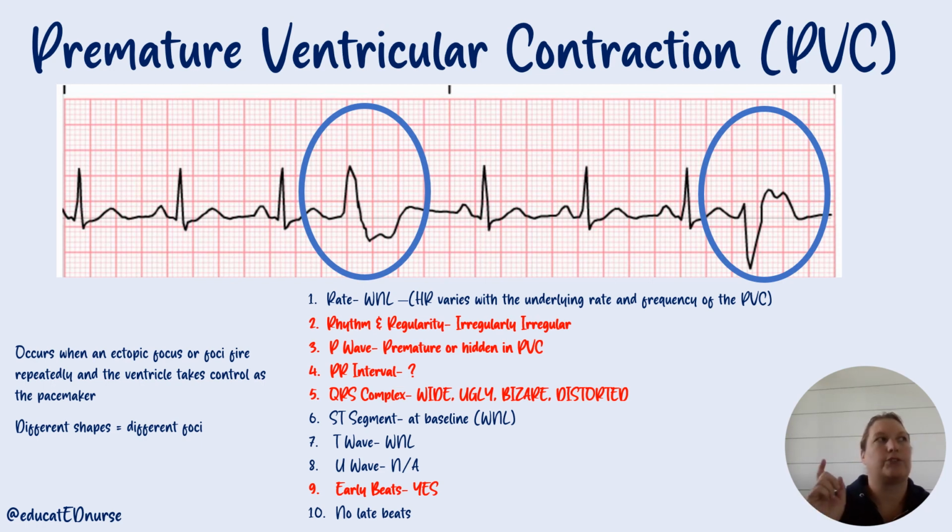So if you have a patient who's clipping along and they're in trigeminy every third beat, and then all of a sudden they go to couplets, I would start to get worried about that patient, because they're getting closer together and there's more PVCs than there are regular beats. That can be a problem.